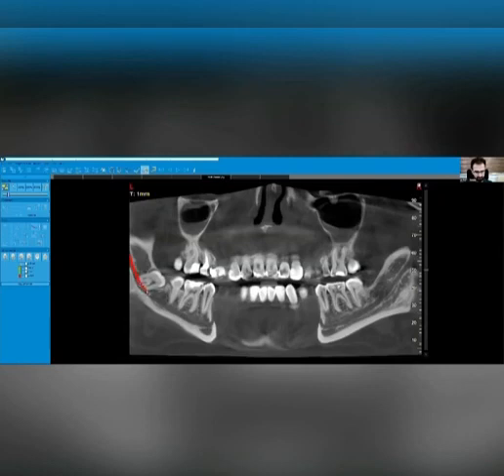There it is. This is assumed to be the nerve through the canal. This is the right side, and this is the left side. Let's go on with the canal. All right. Now we are done. We have a beautiful nerve tracing for this case.